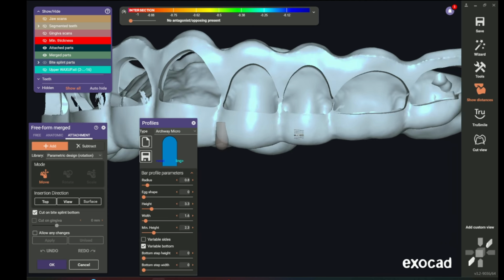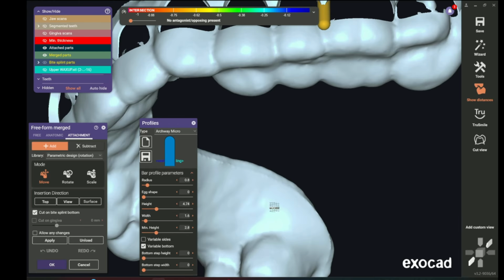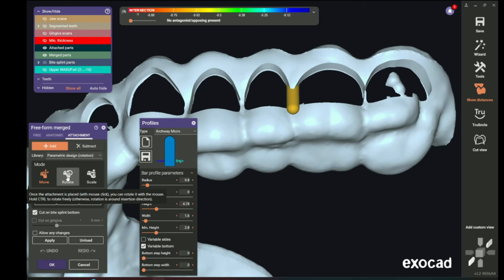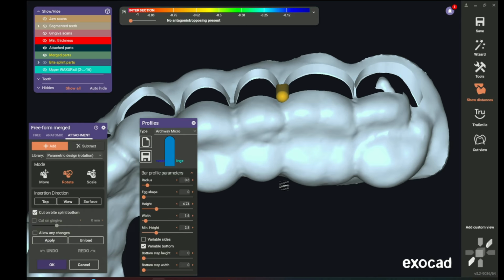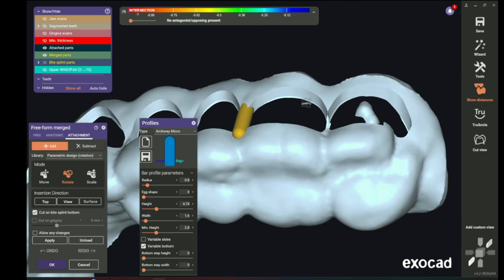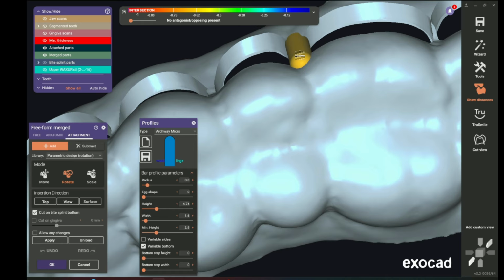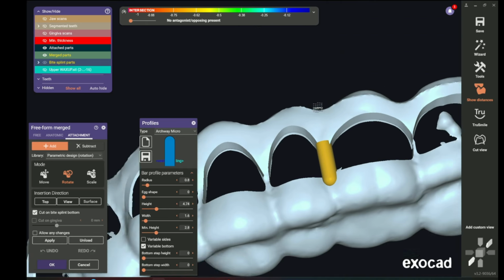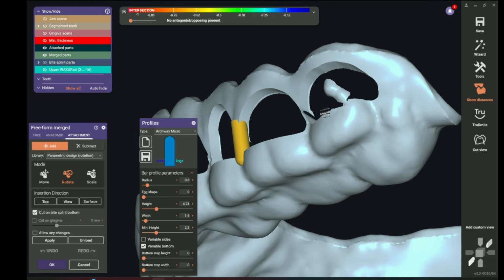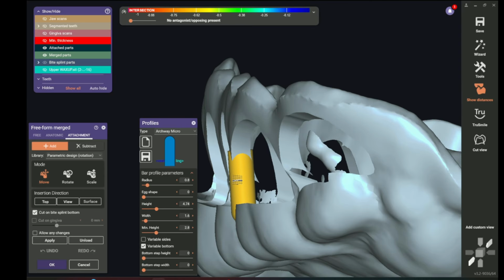In all of these areas where it's really thin, where it looks like it needs some sort of connection, we're going to stick it there. We will extend the height a little bit. And then choose your rotate mode. Make sure it's lined up correctly. So we're going to use control and rotate. Make sure we fit it in there pretty evenly, going up and down. Make sure it's filling the space to your liking.